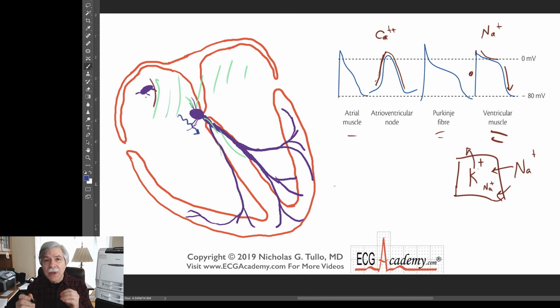And that's what gives you that typical Wenckebach periodicity where the PR gets longer and then sometimes even longer still, and then you'll block a beat, and then the PR gets shorter again. So that changing PR interval, that prolongation of the PR interval, that decremental conduction is what we call it, indicates that you're dealing with delay within the AV node itself.